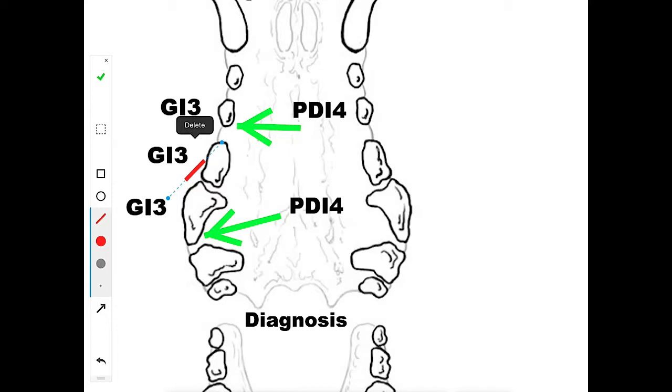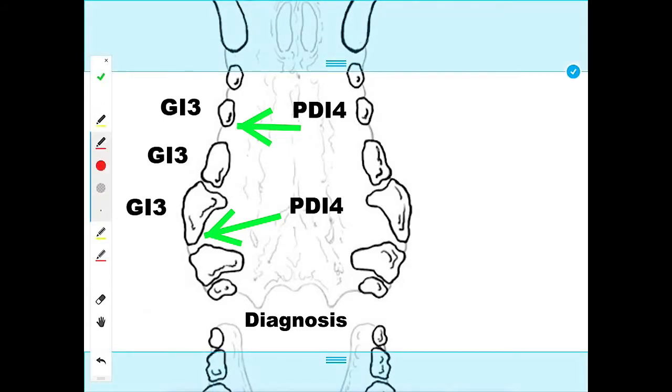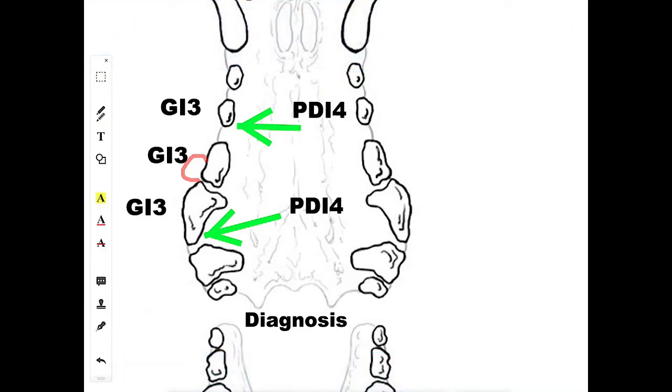Actually, that's the line. We don't want that. Let's go back to the upper check. Go back to the two little pencils here on the upper side, and that'll allow us to make a little line. So again, we go back, let's make that 2 point, and we'll just create a little mass there. There you go. So now go back to the upper check box, the little green check symbol there. We'll check that. And then we had that cups lesion that was present.